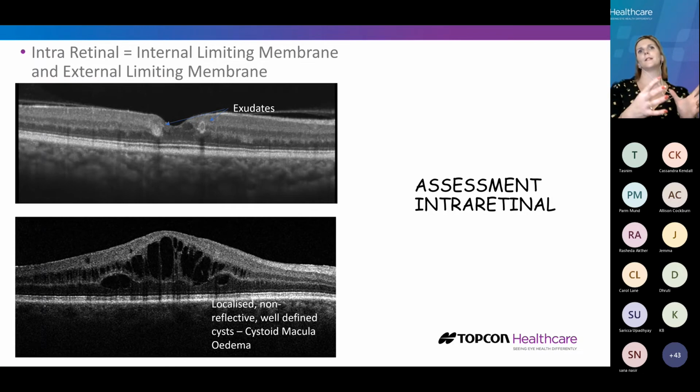So if you've got a patient, for instance, who's got a vein occlusion, you'd see obviously the image on the fundus photo. You should then see a large amount of sort of swelling and edema in that section as well. So you'll be able to build up and start to look at that patient and the story that's happening with them.